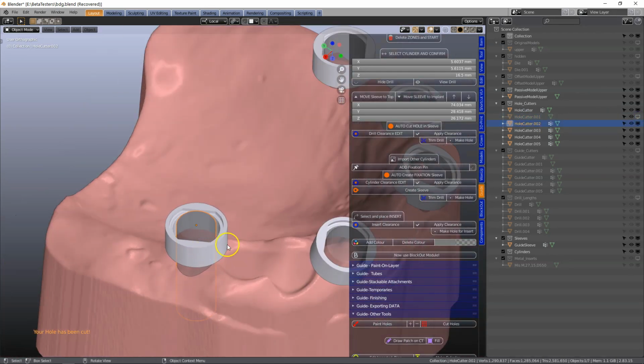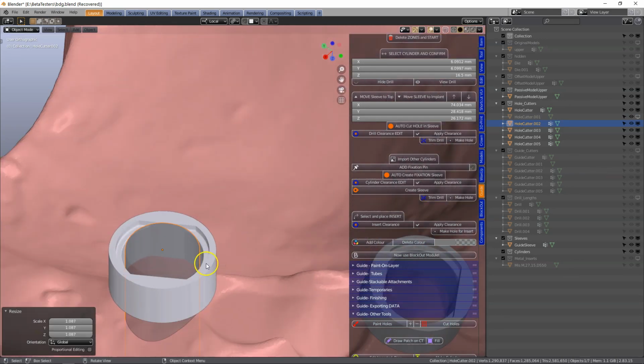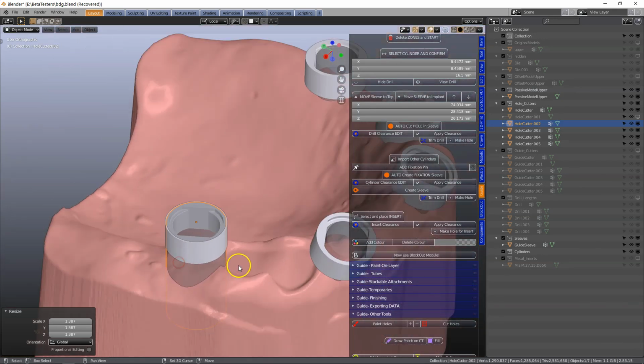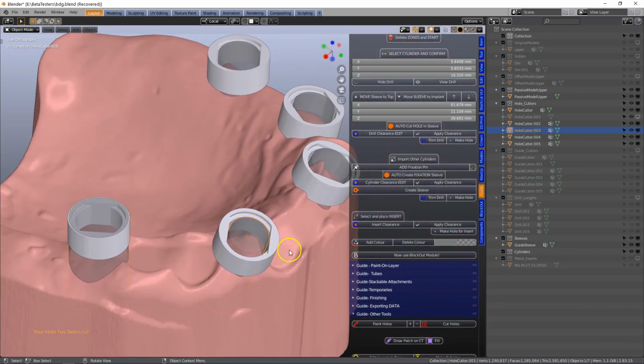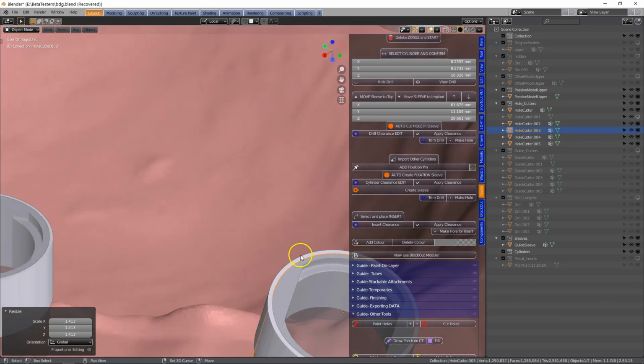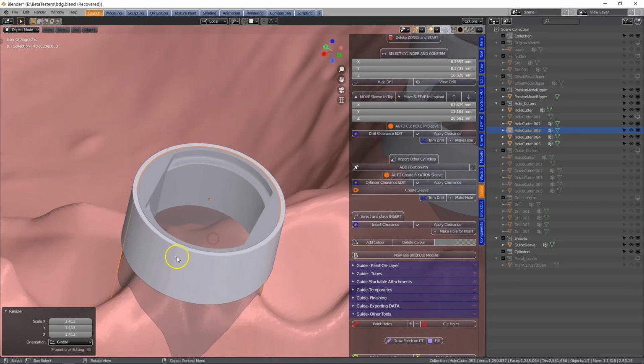Now these we can then scale, and you would have to then scale this accordingly so that you will be able to clear away the intersection inside of it. Okay, so that's a very important thing, because we've actually increased this with the metal sleeve insert.